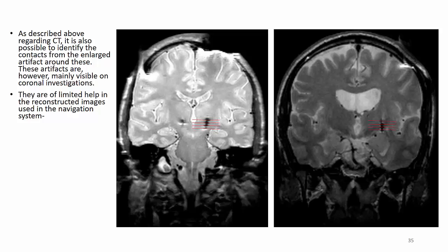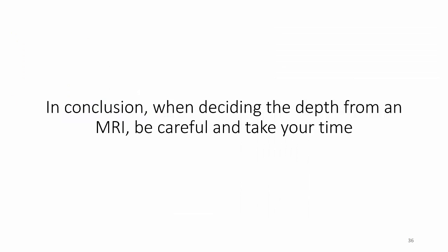As described above regarding CT, it is also possible to identify the contacts from the enlarged artifact around these. These artifacts are, however, mainly visible on coronal investigations. They are of limited help in the reconstructed images used in a navigation system. In conclusion, when deciding the depth from an MRI, be careful and take your time.